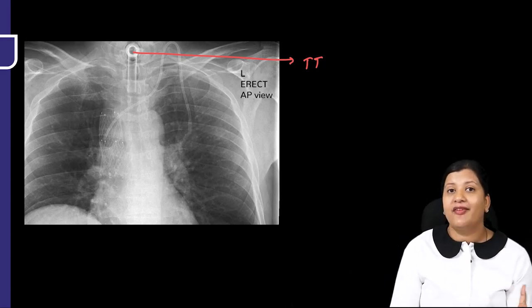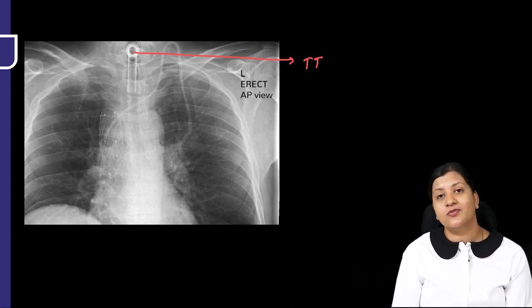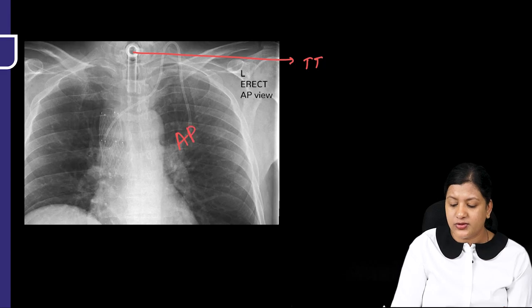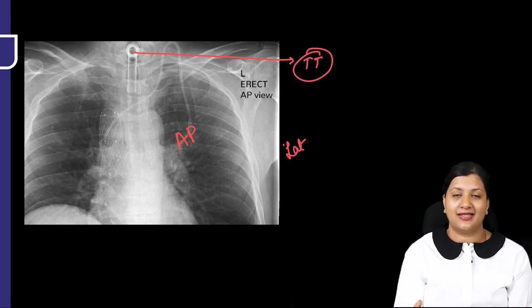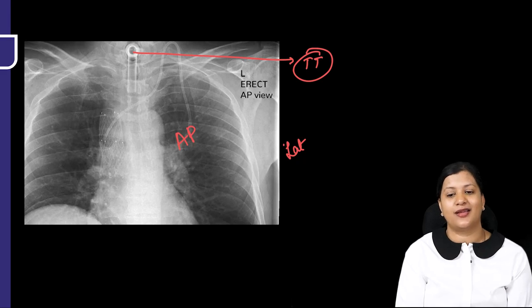So typically after having performed tracheostomy, if you want to confirm objectively the evidence of tracheostomy tube in its position in the trachea, you do an x-ray, not just AP view, you also do a lateral view x-ray that will tell you the position of tracheostomy tube, if it is present in its correct position in the trachea, or has it gone into another position between the skin and subcutaneous tissue, or below the strap muscles, or in a false passage. So to understand that, we will have to take this x-ray, and objective evidence of showing the tracheostomy tube to be in the trachea, not just the anteroposterior. Again, a lateral view x-ray also has to be taken.